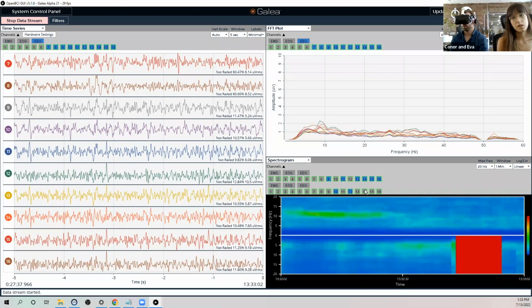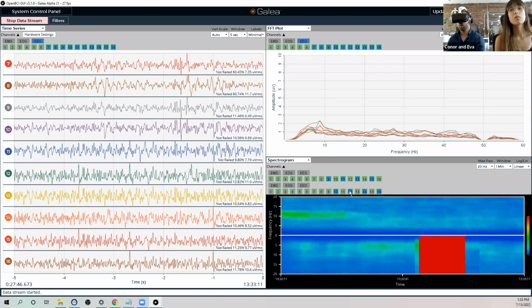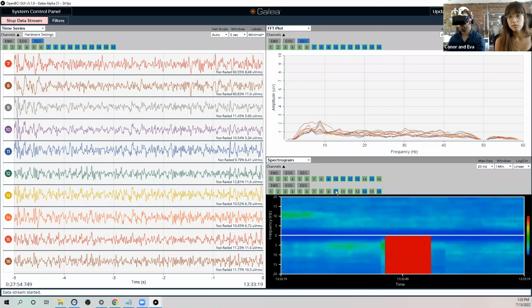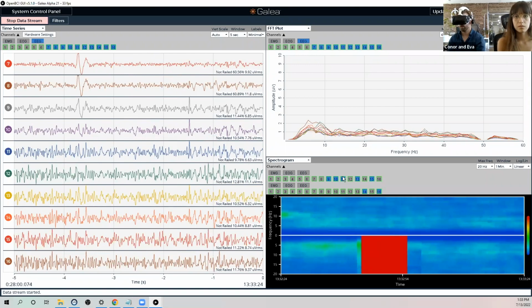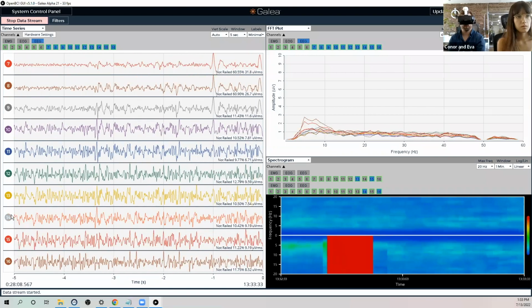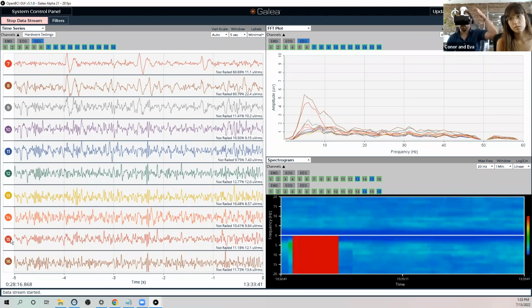And we're only using the active ones for this at the moment. All right, so now we've got left hemisphere on the top. Oh wait, that's not entirely true, because 9, 10, 11, 12 are midline. Actually, let's just get rid of the midline. We'll go left and right. So now we've only got channels 13 and 14, which are P3 and P4 roughly, and then 15 and 16, which are O1 and O2 roughly.